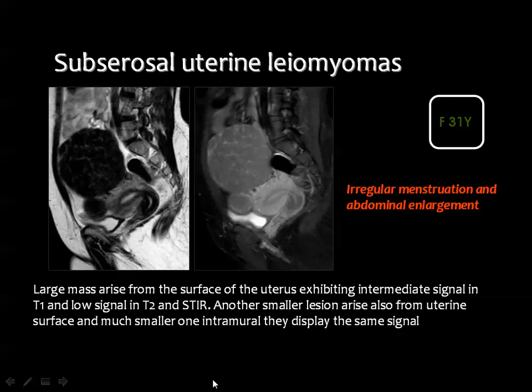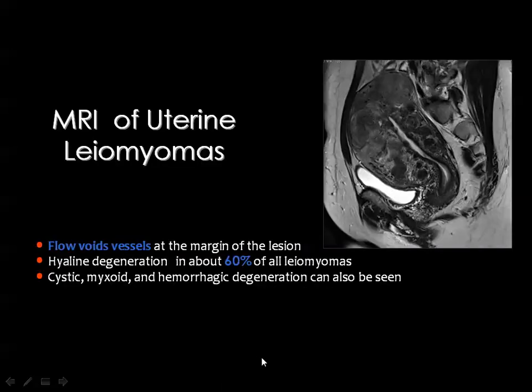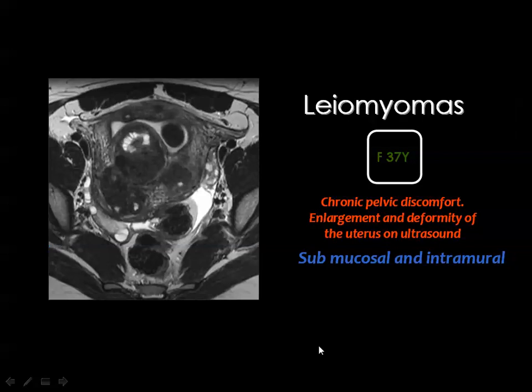the uterine fundus. And whenever the leiomyomas affect almost the entire myometrium, this is known as uterine leiomyomatosis. And you can easily appreciate some of the normally appearing fibroids of low signal, and some others which have undergone degeneration.